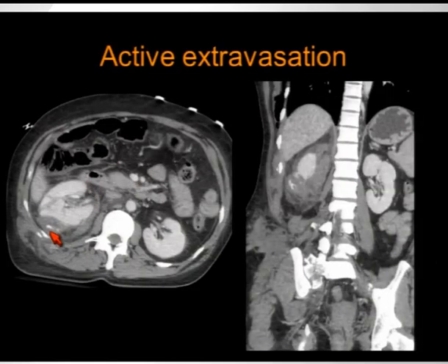And again, here we have an example where there is active extravasation from the posterior aspect of the kidney here. You can see here on the coronals. This will require immediate management, and this is the sort of thing that, again, in the kidney will almost always be embolized.